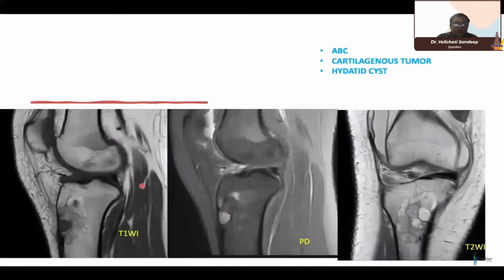So the MRI shows a relatively well-defined lesion in the anterior part, which contains some fat signals, some fibrosis, some sclerosis, some cyst. We considered these fat signals to be native fat distorted by the lesion because they all got suppressed in fat-saturated sequences. That is our thought process, that the fat is not part of the tumor, but residual or distorted marrow due to the infiltration of the tumor. The tumor contains multiple cysts, cystic solid areas as well as some fatty signals on these T2 weighted images.